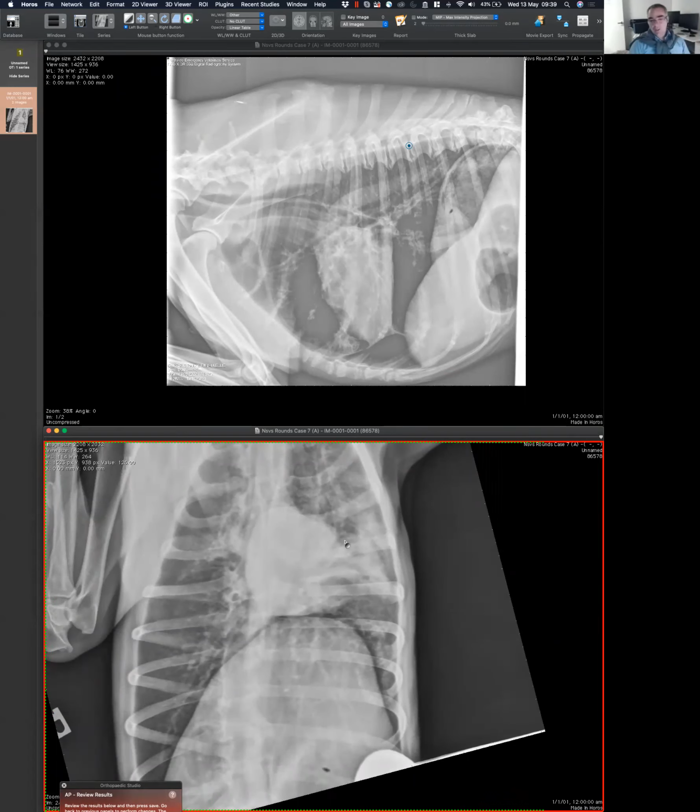However, now that you mentioned that there were 5 days in between, I'm not sure what to say about that. I don't know if there is a bronchopneumonia rather than aspiration pneumonia that is probably not related to the anesthesia. It feels too long to have 5 days for an aspiration pneumonia to show up, not only on the radiograph, but clinically. So there, I don't know. That was my question as well with this case. It just didn't make sense.